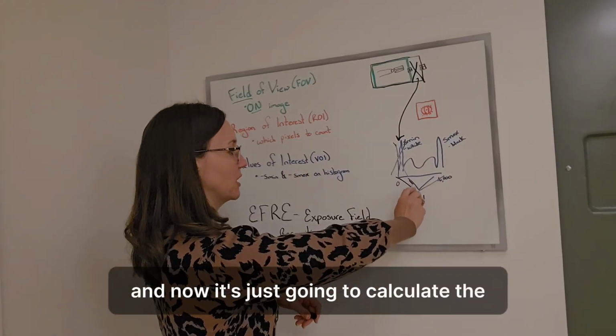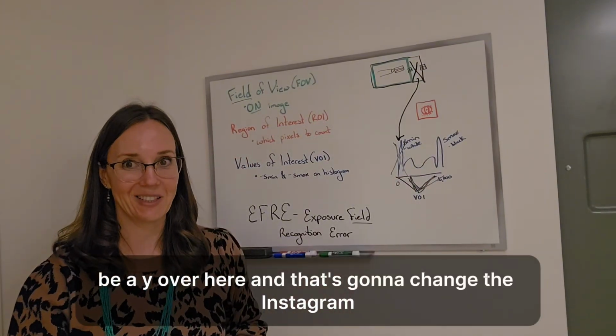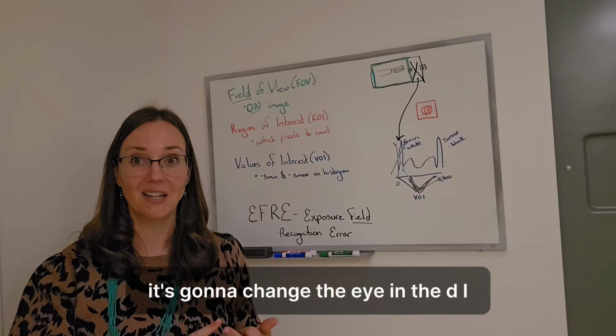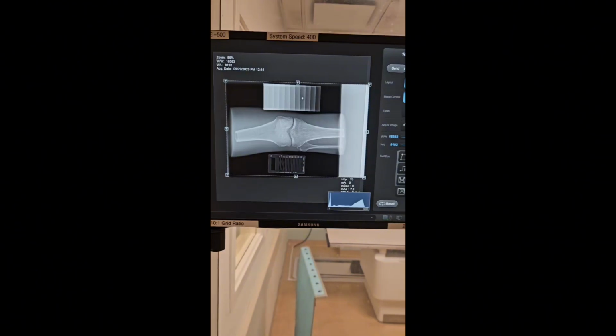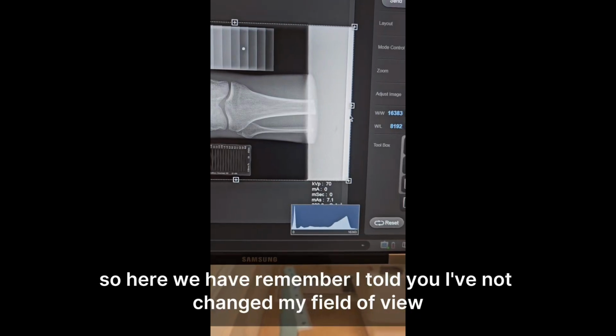And now it's just going to calculate the VOI over here, and that's going to change the histogram. It's going to change how the image looks. It's going to change the EI and the DI. Okay, let's do it. So here we have, remember I told you I've not changed my field of view.